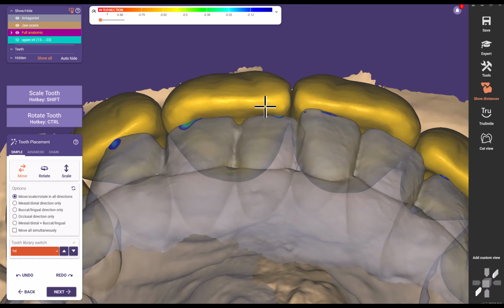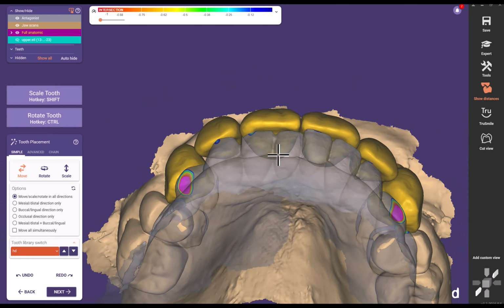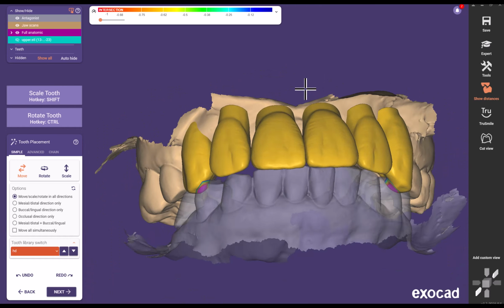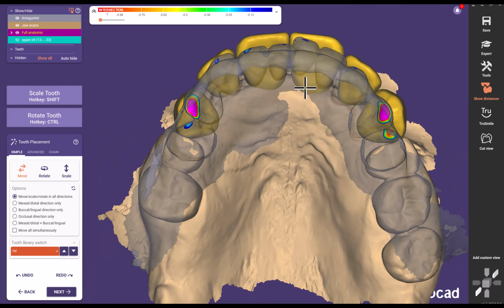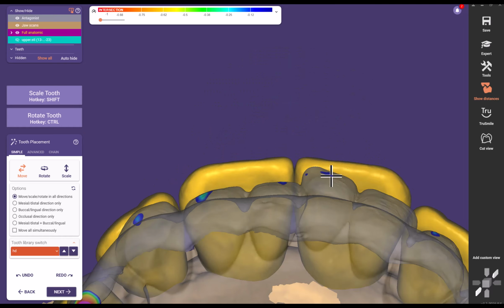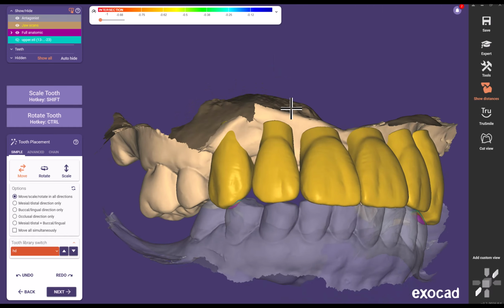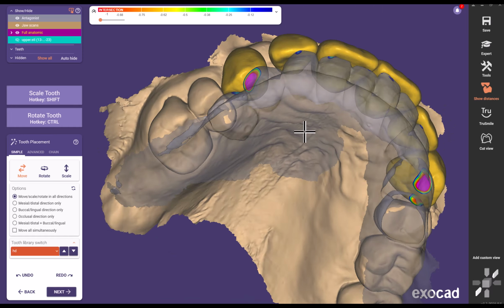this incisal edge just a hair, and we're most definitely going to need to do some plasty on the lower, right? Bring that corner of this tooth in. Be really helpful if we could do some ortho on this, but I just don't think that that's going to be a feasible thing to pull off.